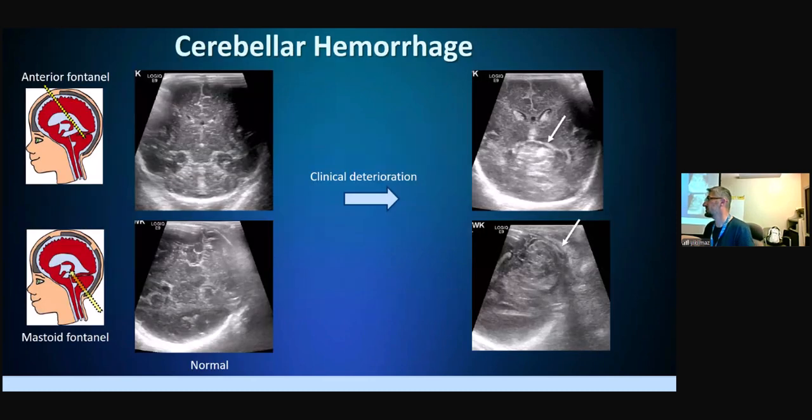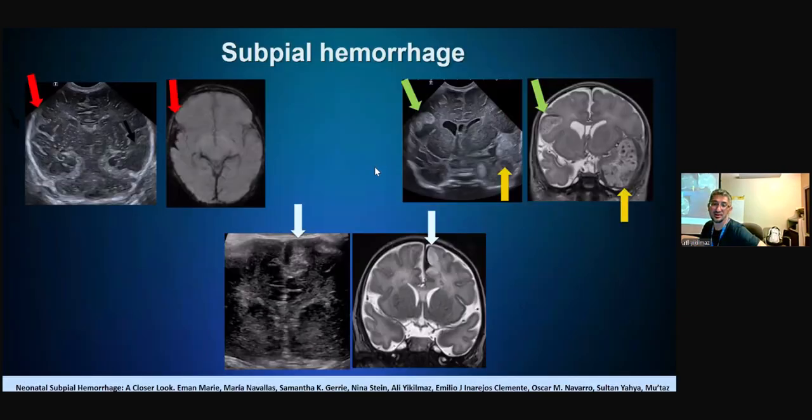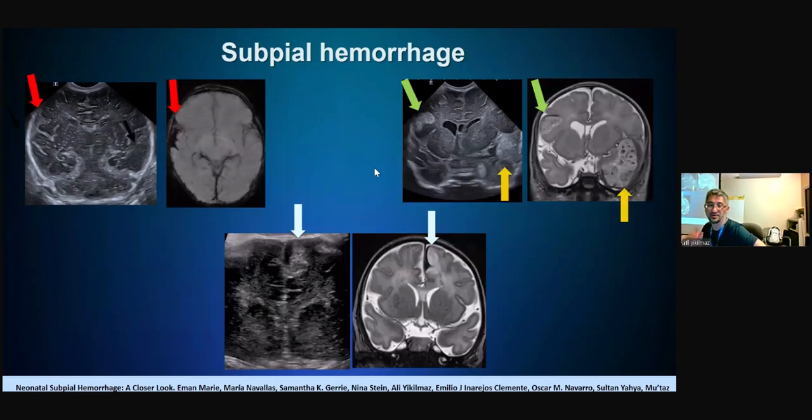Okay, I have one more question. Sure. For the coronal MRI, you have on a prior slide where there was all these. This one. What's the topic? Subpial. Subpial, okay. Next one. That one. Okay, so bottom right. Subpial is the dark, the hypointense area, and then the bright is infarct. Yes, cortex. Okay. It's confined to here.